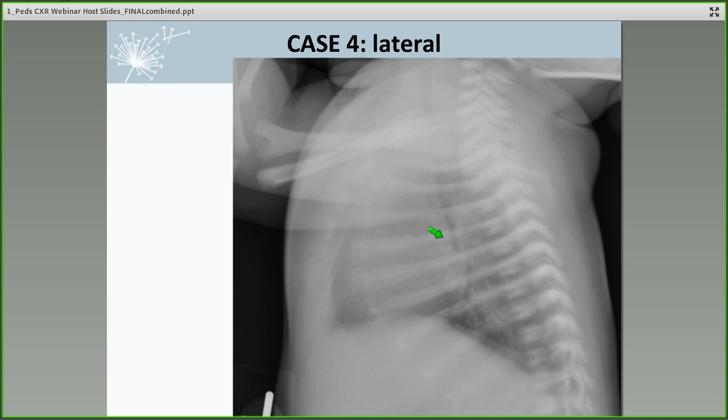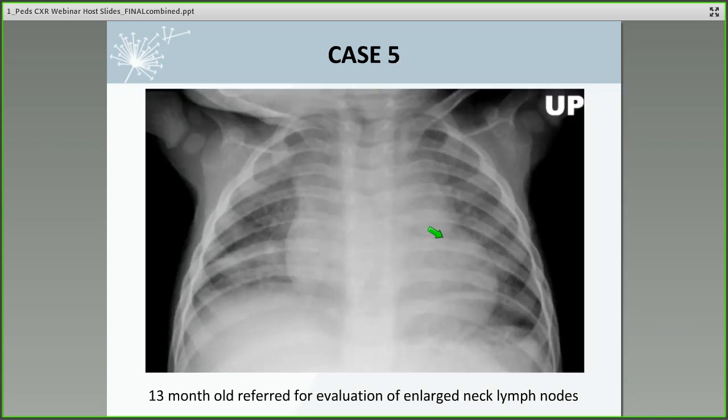So when I think of those two features that Dr. Vu highlighted, the peribronchial wall thickening, we sometimes call that peribronchial cuffing, and hyperinflation, that is bronchiolitis until proven otherwise, often with pneumonia, and there was nothing about this case to make us think of tuberculosis. But I just wanted to remind you that I often get that question, oh, here's some perihilar infiltrate or peribronchial cuffing, cannot exclude tuberculosis. Well, guess what? I exclude tuberculosis in that case.